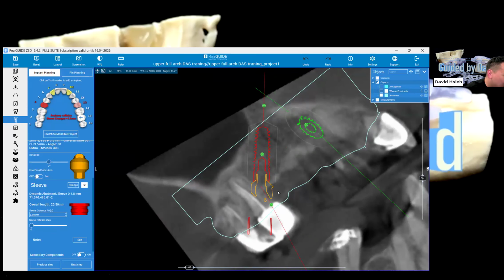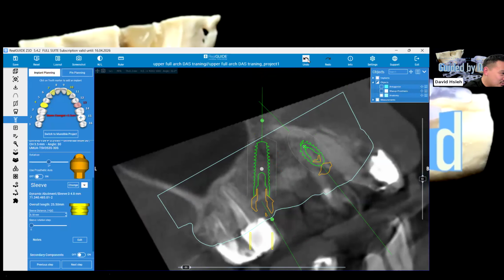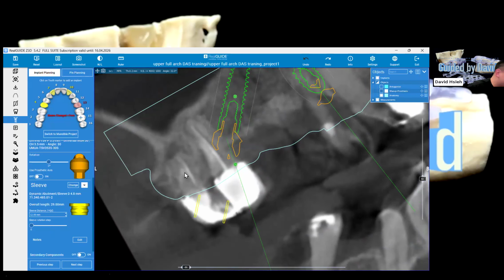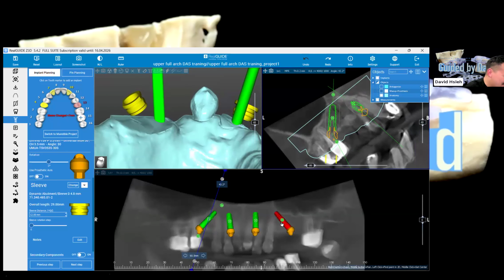Actually, after planning the implant, you shouldn't touch it anymore. But now you can see, when the design needs it, you can change the trajectory. Now it's free, but it's not a good thing to do because we're losing AP spread right there. So for now I just have to keep increasing until I'm free from that area. Oh my God, this is crazy. I can go up to 12 millimeters. So how much did I get? I increased by 7.